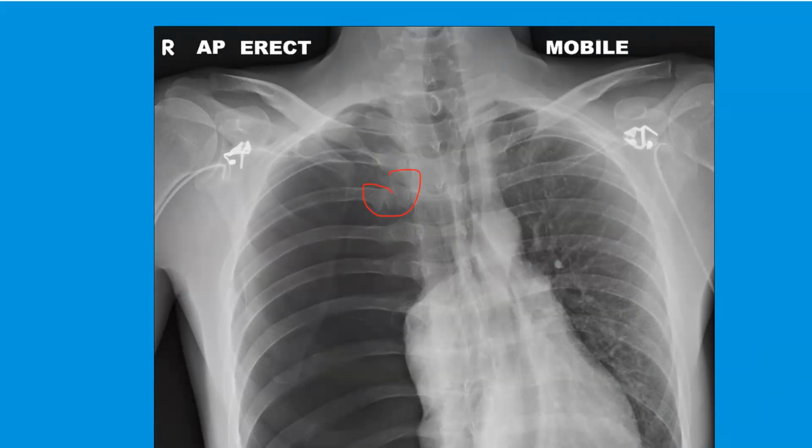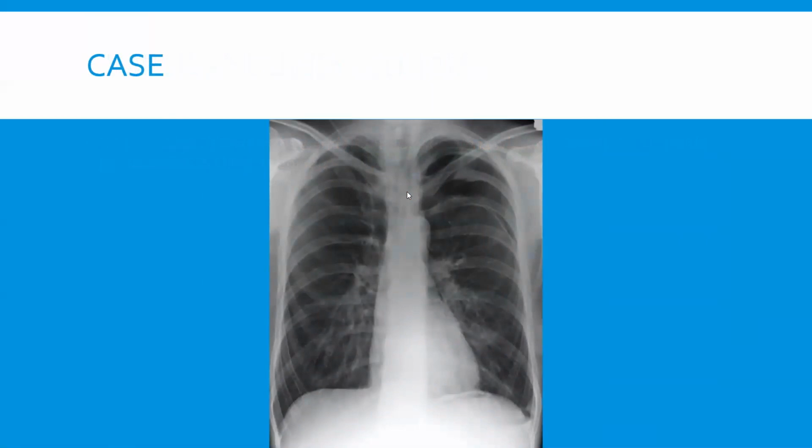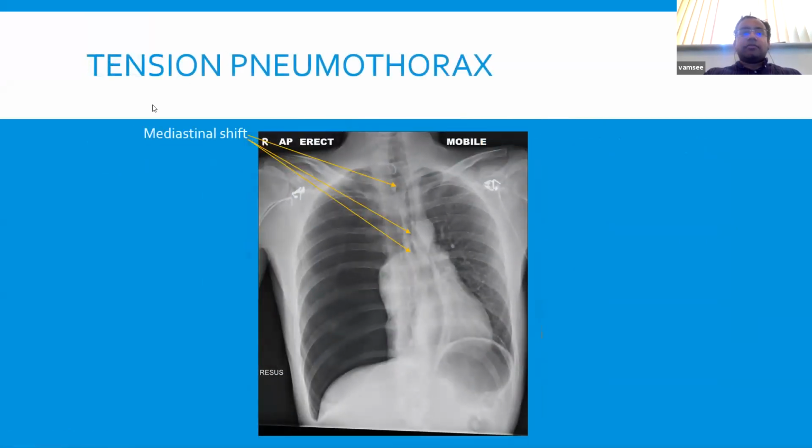Oh, brilliant. Yes. So that's normal rib. That's just the costochondral joint. Thank you. Sorry, my screen is going back for some reason. There we go. I just highlighted the different points with the markers. Yep, that is fine. I think everyone's got that.